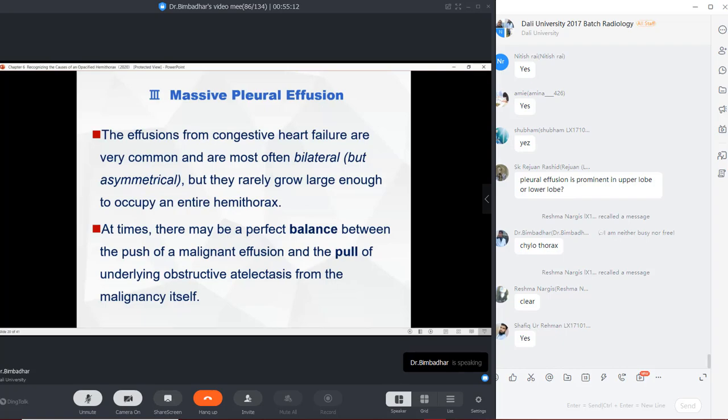In an adult patient with an opacified hemithorax, there are no air bronchograms. So no air bronchogram means no pneumonia. How can I differentiate pneumonia from pleural effusion and atelectasis? No air bronchogram, and there will be no volume loss in pneumonia either. But there is volume loss here, so that is how I differentiate, right? So a CT scan of the chest will also reveal some abnormalities.